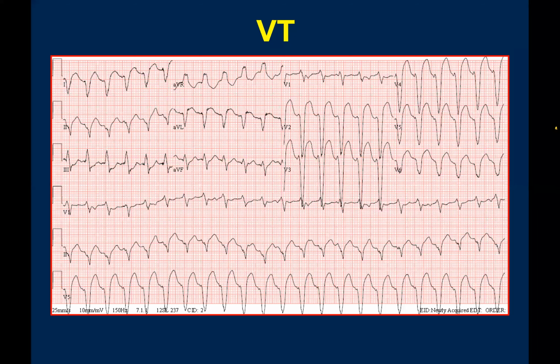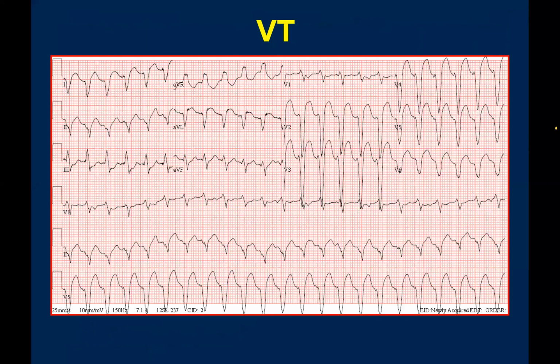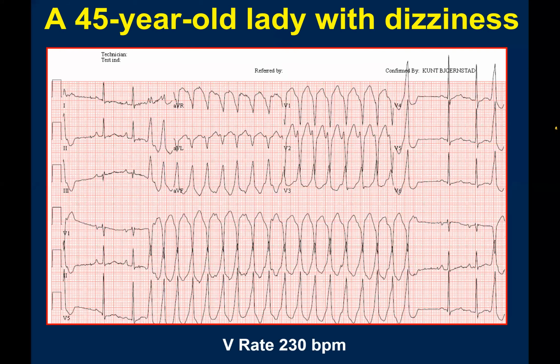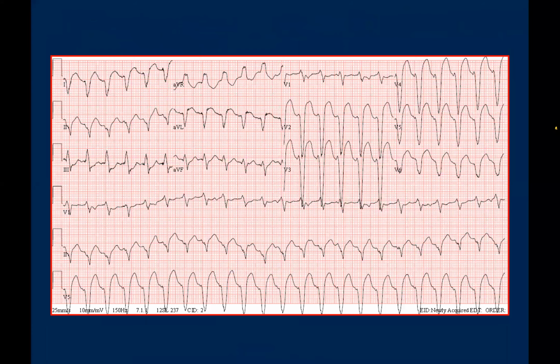Okay. Dr. Bandar? Sure, go ahead, please. You said left bundle. Is this left bundle or? No, not this one. The purest one is left bundle. This one, I'm sorry, it takes a few seconds for you to see it. This is the one which is left bundle-like morphology. This one is more of right bundle because of RS in V1. Yeah, okay, thank you.